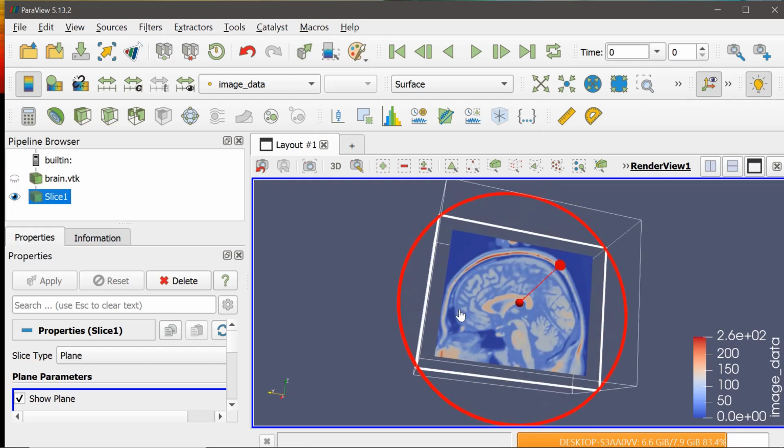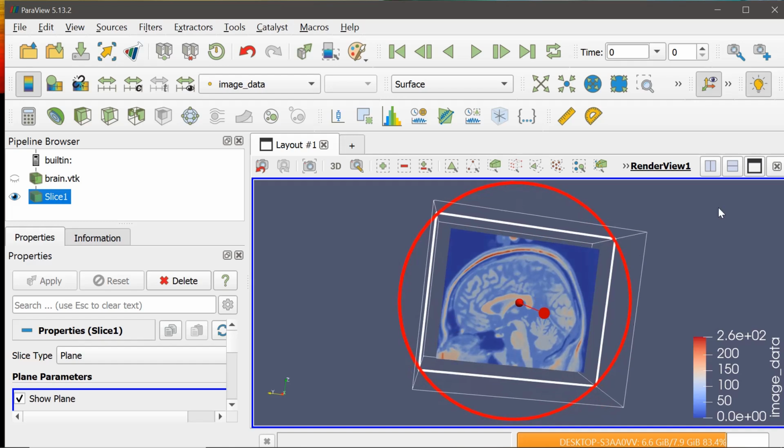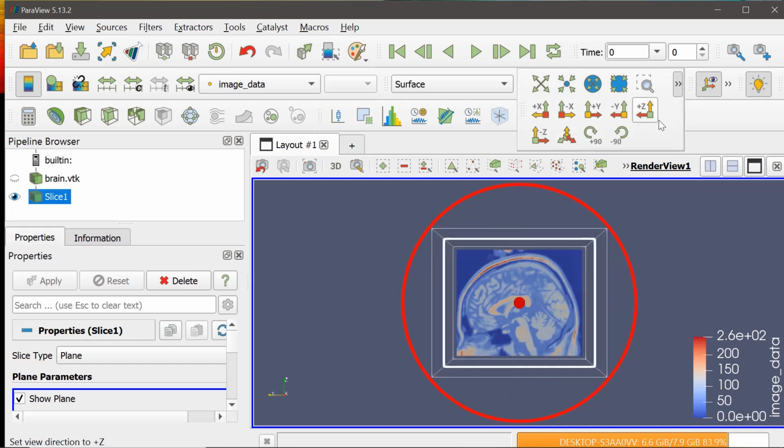If we tilt this, we are able to see our slice. Now you can see that this is the skull and this is the brain and all its composition. Some of these insights are normally used to understand human anatomy.